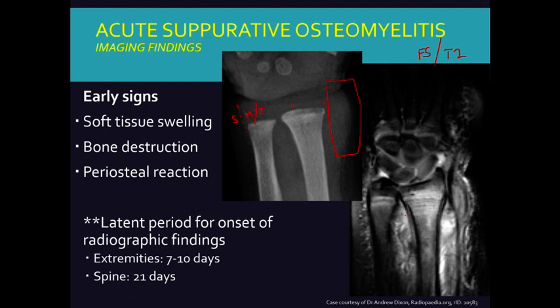A note on the ulna on this side, this is the growth plate right here. So the growth plate does have some more change, some more T2 signal, but that's a normal expected type of appearance for that. We can see the epiphyses as well, which we don't see here because they're cartilage. So it's lucent on the X-ray, but visible on the MRI.